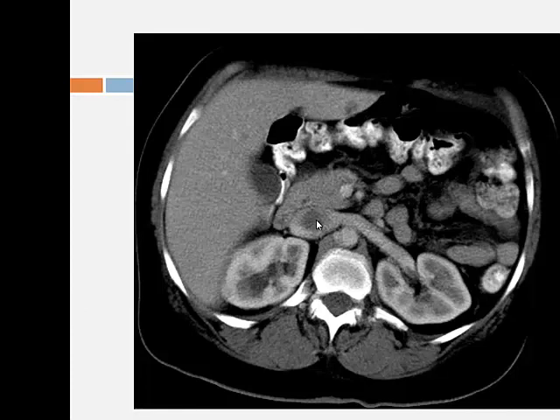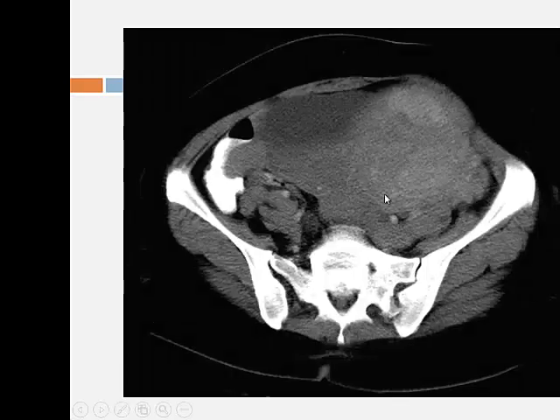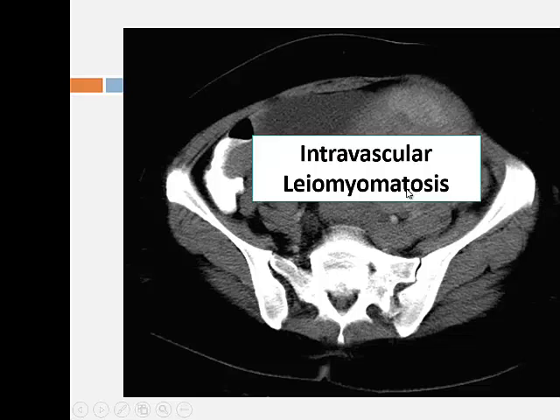Yeah, renal carcinoma is the first thing to exclude, but the kidneys look normal, at least the bits that we've got. So I'll give you a clue, it's a lady, and as we scan down, you can still see something in the IVC. Not sure what that is. What the hell is that? So what is it? Classic case?